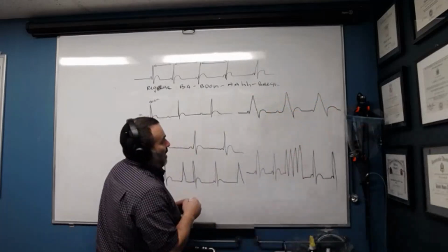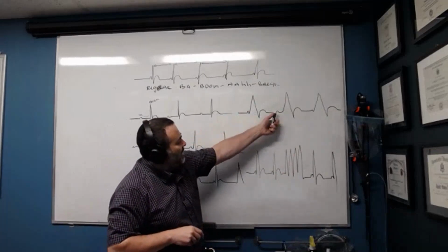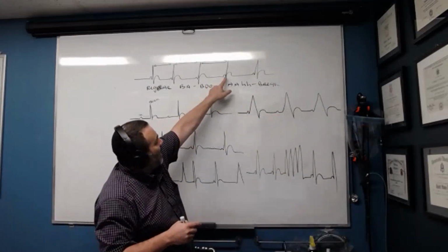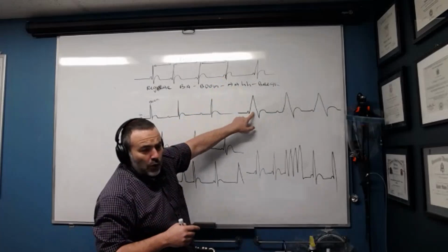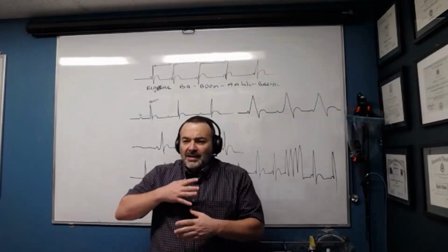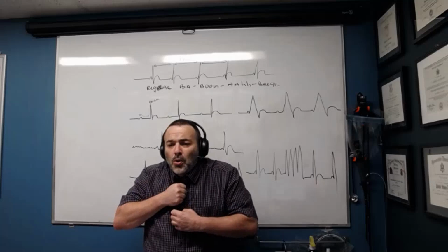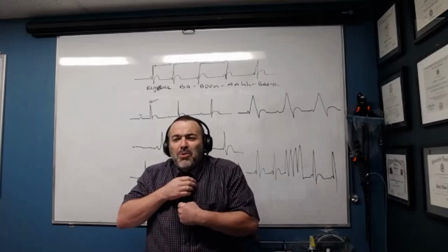What happened here? You got the ba, you got the boom, you got the ah, you got the break. Everything seems to be going okay, except how is this different from the one on top? Now look at this. The boom is not your sharp and crisp boom. It's not ba boom, ba boom. It's more like a weak ba boom, ba boom.